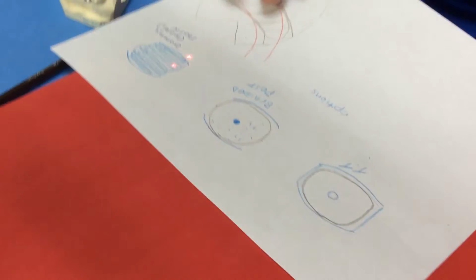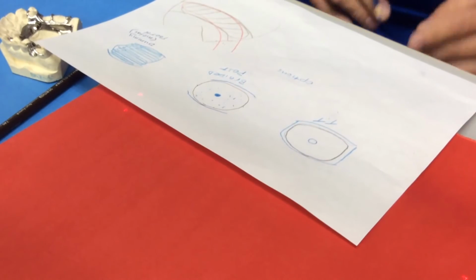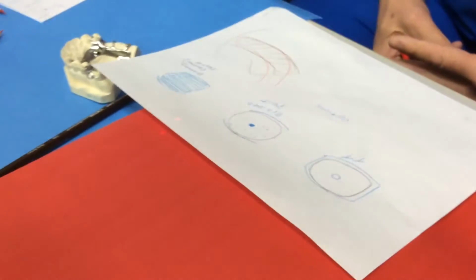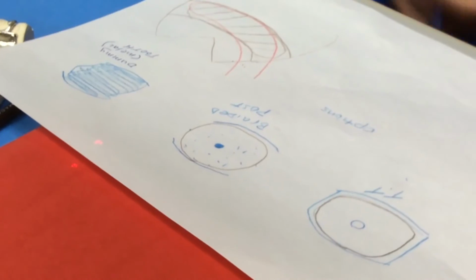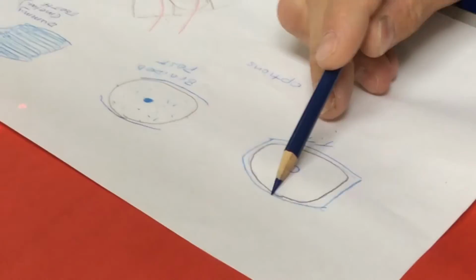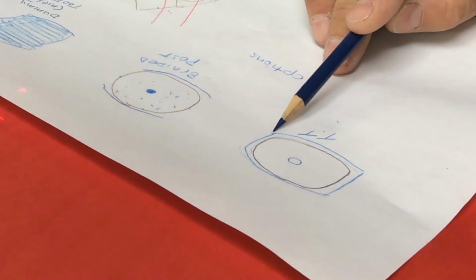Okay, I'm going to move to this drawing because Dr. Smith and I disagreed, and part of that is just our difference in training. So one way is to draw a tube tooth, and a tube tooth is indicated this way. We have our buccal finish line, we have our lingual finish line.